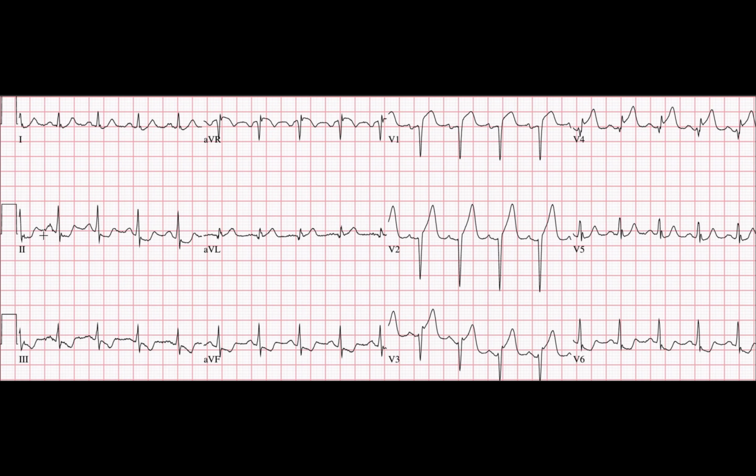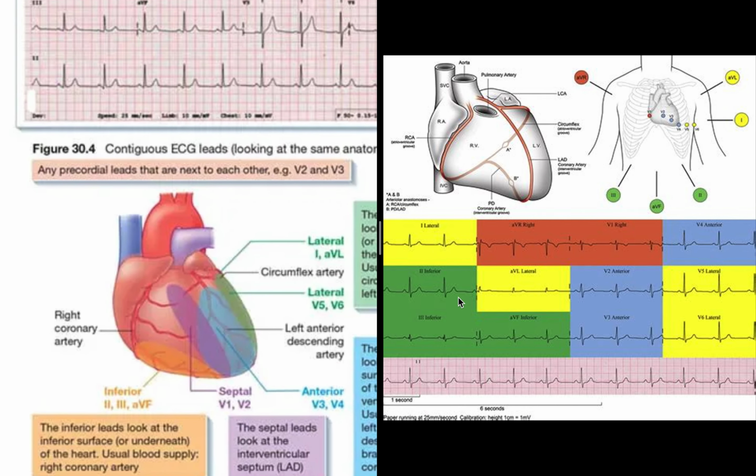So back to here. When we're looking at this guy, lead 2, notice we have ST depression. The S part of that wave, so we have our P, Q, R, S, and then the T. That's like this down-up little motion. We call that a biphasic T wave, ST depression. That's an issue. We see those in leads 2, 3, and AVF. Those all look pretty similar. Okay, so we have ST depression. That's a problem, because if we look over here, 2, 3, and AVF are our inferior leads, so they're looking at the bottom of the heart.